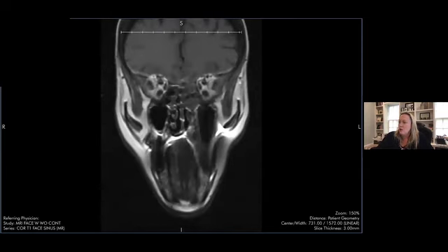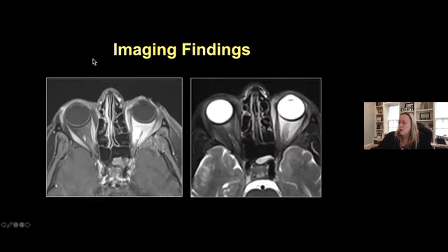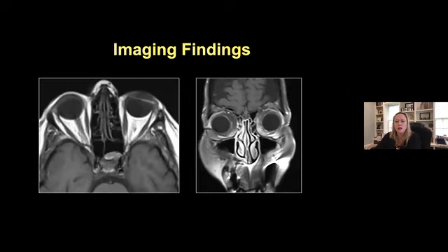Now I'm going to go back to the PowerPoint, and we're going to review some of the salient imaging findings. Again, we have the T1 post-contrast images with apparent enhancement throughout the left orbit, and T2 hyperintensity throughout the orbit. It appears as if there's a diffuse abnormality, but there's no abnormal soft tissue on the T1 weighted pre-contrast images, and we can see this dental amalgam artifact on the coronal T1 weighted fat saturated post-contrast images. See how there's fat saturation.